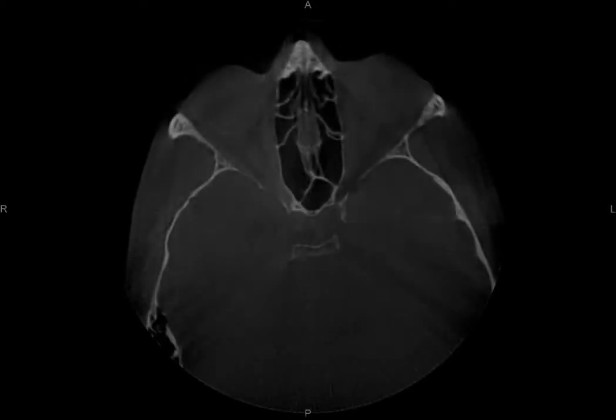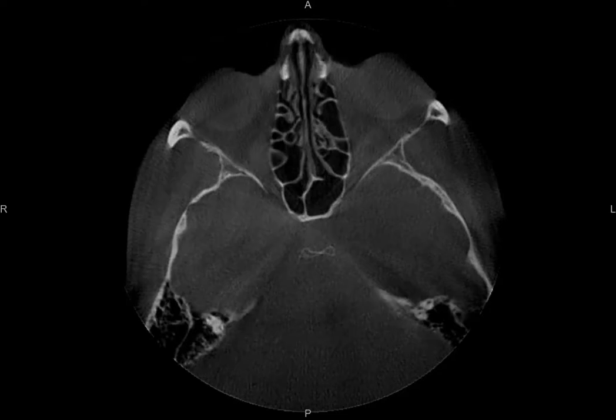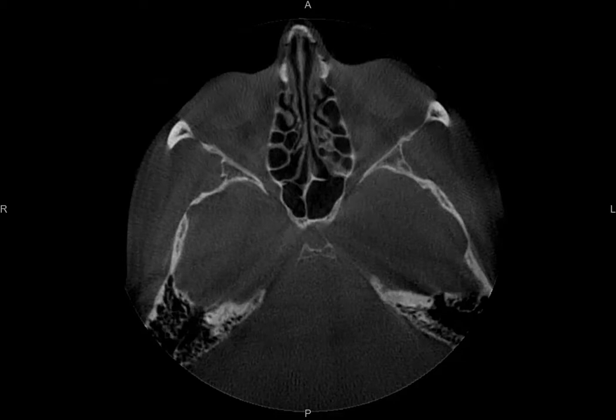Now that we've walked through all the slices in the coronal view, we'll now do the same thing in the axial view. With this view, we are looking toward the superior of the patient. In other words, it's as if we were at the patient's feet looking up towards the head. In examining the slices, we're starting at the top of the volume and migrating inferiorly through the volume.